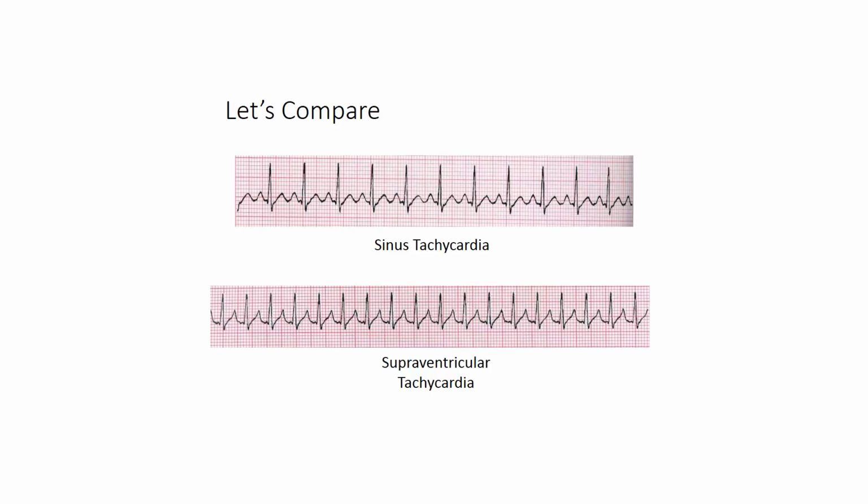Now, when we move down to the second strip, I can't tell if that spike between the QRS complexes is a T wave or a P wave. Maybe it's an F wave. Maybe there's some chaos going on in there, but I just can't see it. And this is a good reminder of why it's important to understand our EKGs are showing us a summation of activity. So there could be some hidden atrial fibrillation going on there, but I can't see it because the ventricles are beating so fast that there's more electricity in the ventricles than in the little atrial fibrillation that could be hiding.